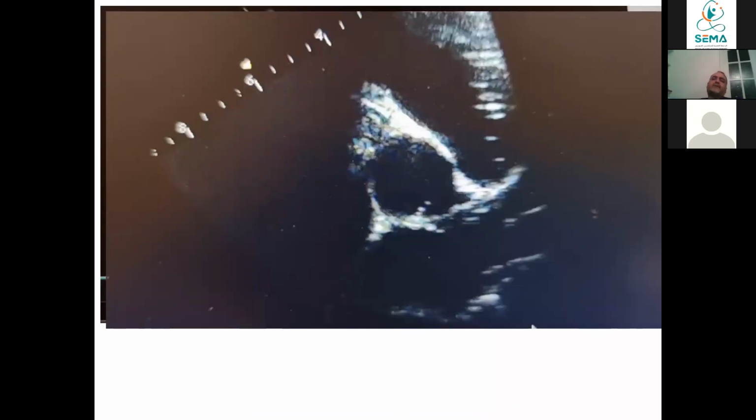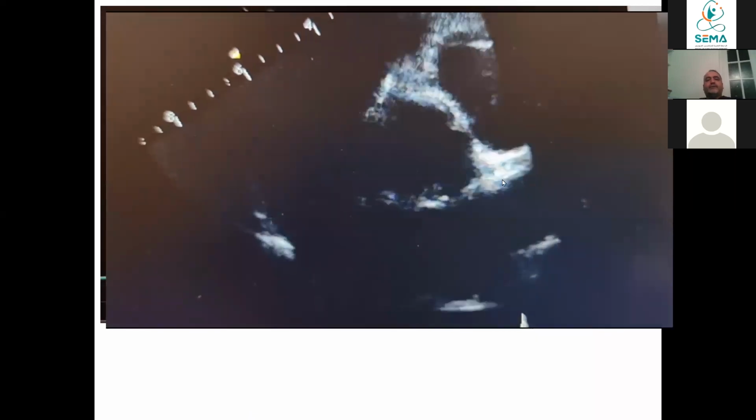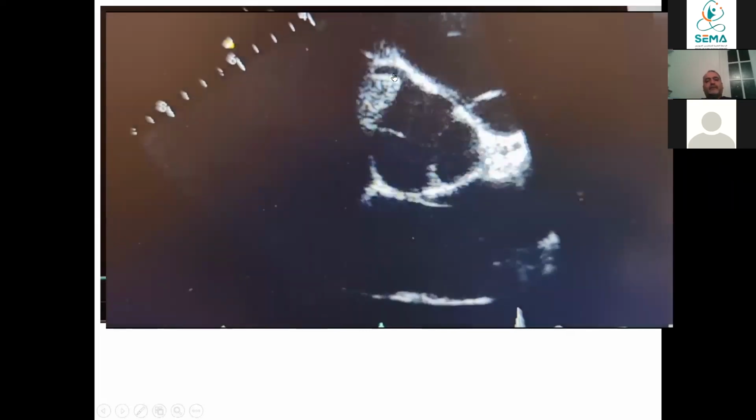Another view, not important in neonates, but sometimes in a very rare condition, anomaly of the coronary artery, left coronary artery anomalies, which is very rare. How to know where the coronary artery is from the short axis view, looking at the aortic valve area, you will see this view. From this view, this is the right coronary artery, RCA.